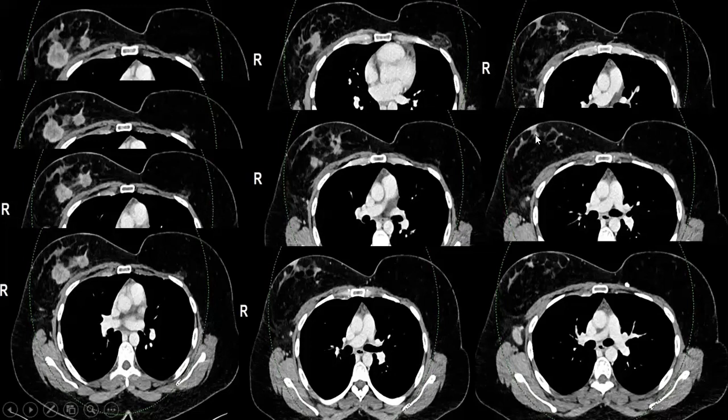And look here, even this satellite nodule is very close to the nipple. And these are multiple lesions here. So the question here is, is the pectoralis involved or not? And what about the contralateral breast? You said in the contralateral breast there is recurrence. Could you appreciate the recurrence here? This is calcification. There is an area in the first row. The middle image, yeah, that is the area.